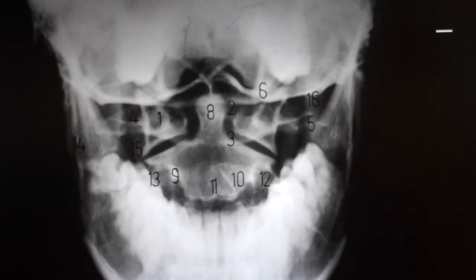Now the reason that we take this film A to P is because that gets the object that you are looking at closer to the film, and you always want a decreased film object distance. When you read this P to A, you are basically reading it the same way that you would be identifying the patient's left side and right side. This is called patient-doctor orientation, so that the patient's right side is on the doctor's right side.